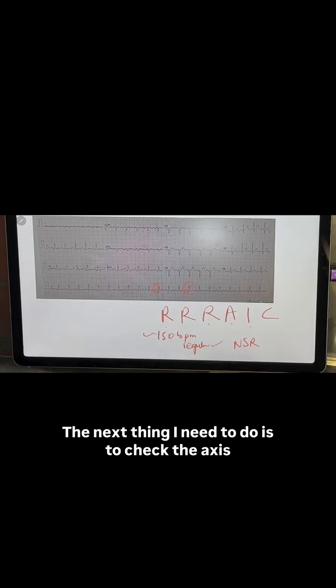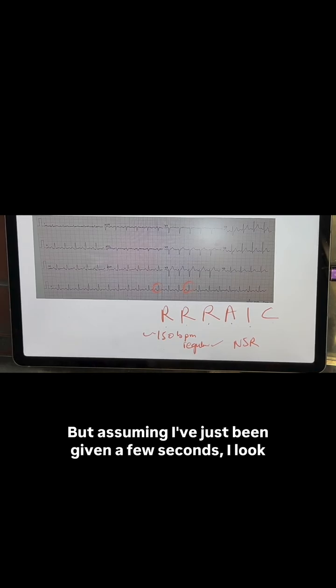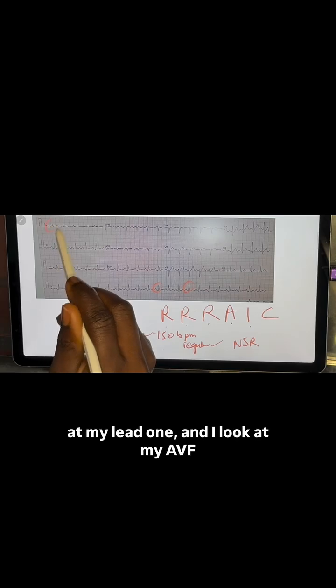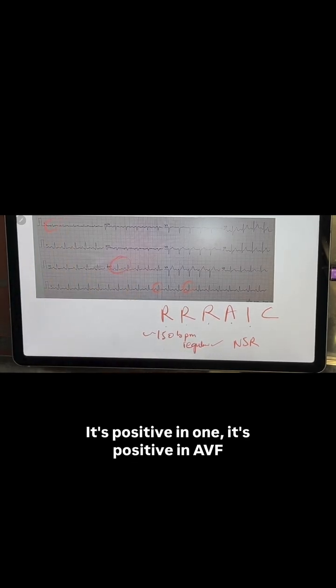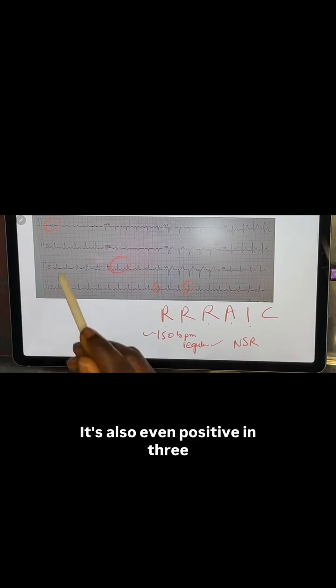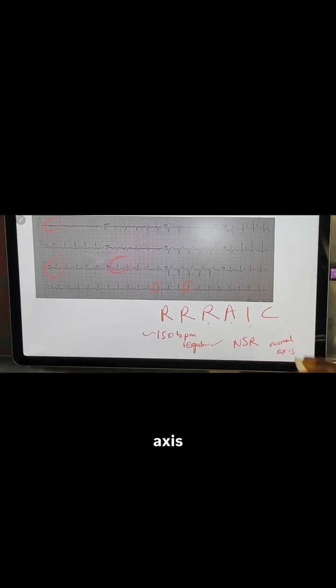The next thing I need to do is to check the axis, and there are a lot of ways to check the axis. You can go the long way or the hard way, but assuming I've just been given a few seconds, I look at my lead 1 and I look at my AVF. It's positive in 1, it's positive in AVF. It's also even positive in 3. That makes this a normal axis.